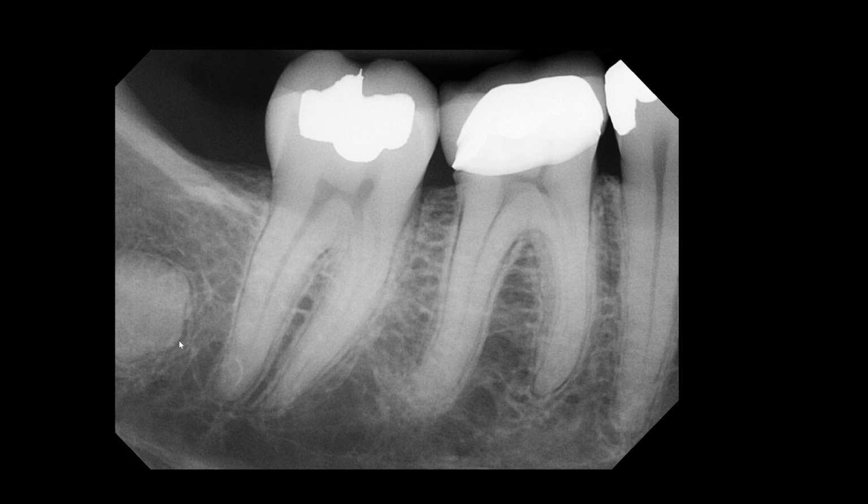Those entities will not have a radiolucent rim. They will have trabecular bone that usually blends right into the opacity, whereas in this case that's not so. So you can rule out osteosclerosis.